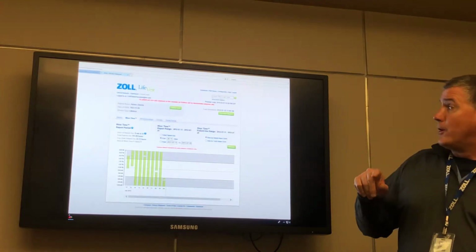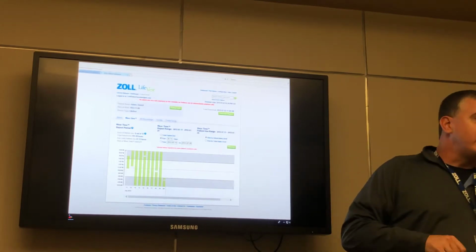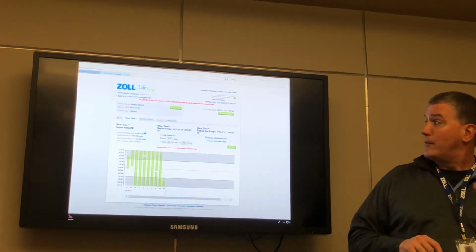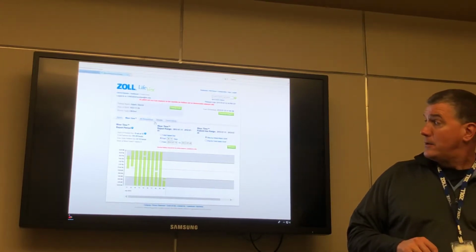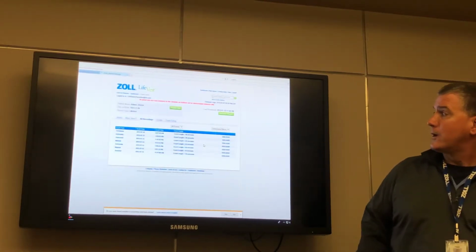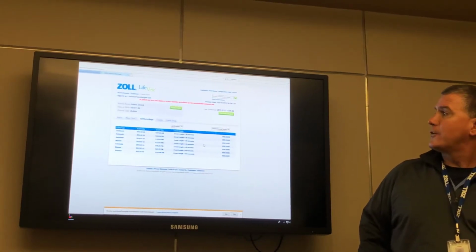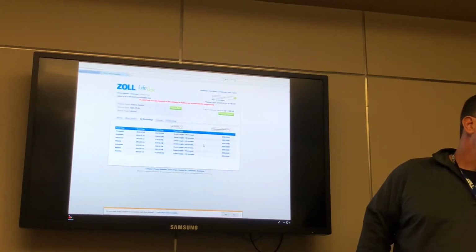So this is important also. So we did wear time. The next box is all recordings. Those are just all the ECG strips. Click on that one. You want all recordings? It's spinning, I can see it. Okay. So on this patient, 1, 2, 3, 4, 5, 6, 7. There's 7 ECG strips there.